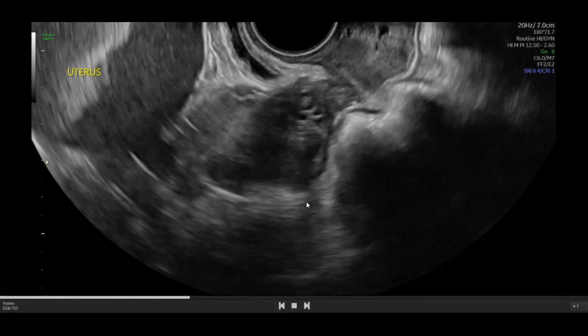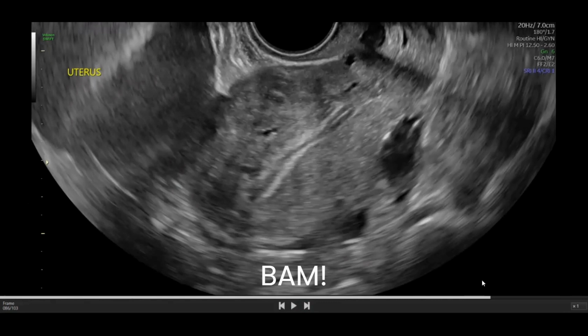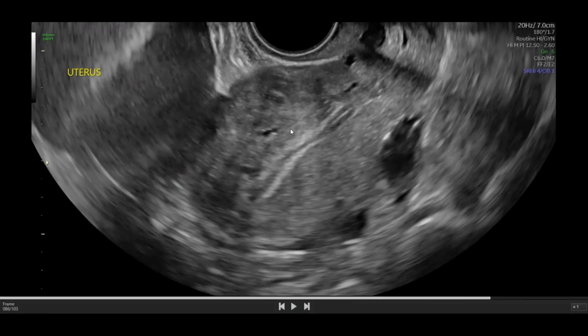As I indicated in the first video, we will stop, and I just happened to stop on something very interesting, but we'll scroll through it. Why not just stay here for a moment? We have a very clear depiction of a myometrial cyst, anechoic contents with a hyperechoic rim. We can appreciate that this anterior myometrium has already quite a few fan-shaped shadowing effects. Maybe we're going to have another myometrial cyst here.